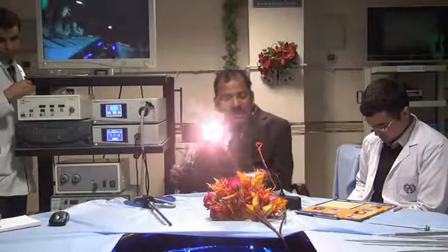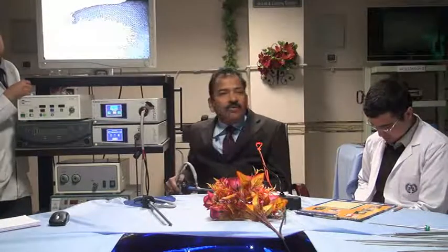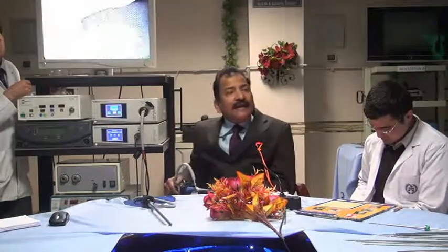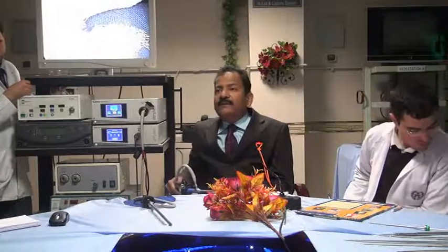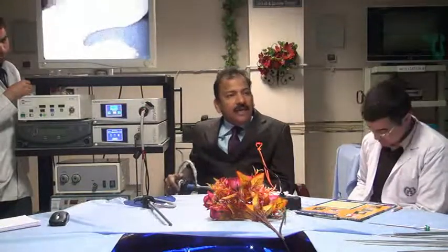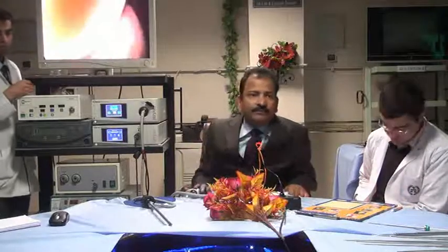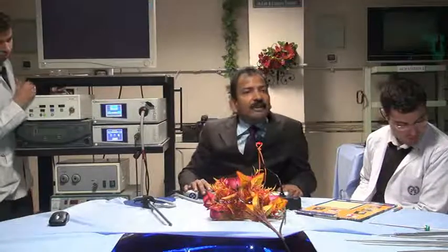in which the camera is adding counter impurity to remove added impurities. Definition of white balancing is, it is a digital phenomenon in which the camera is adding counter impurity to remove added impurities. Now it will be very simple to understand just by one example. The camera is adding counter impurities to remove added impurities.